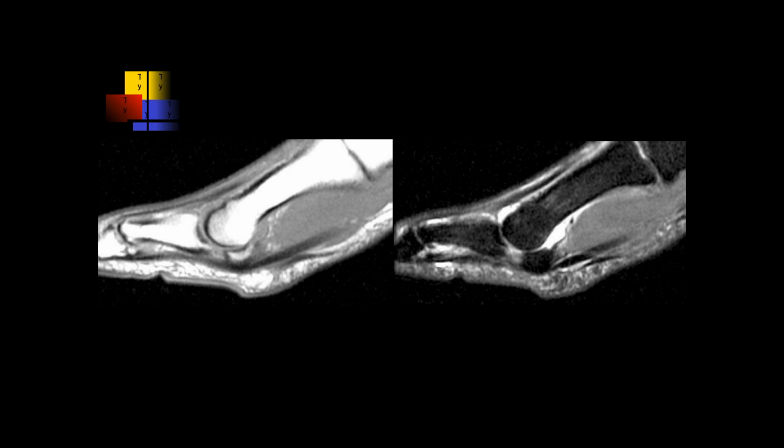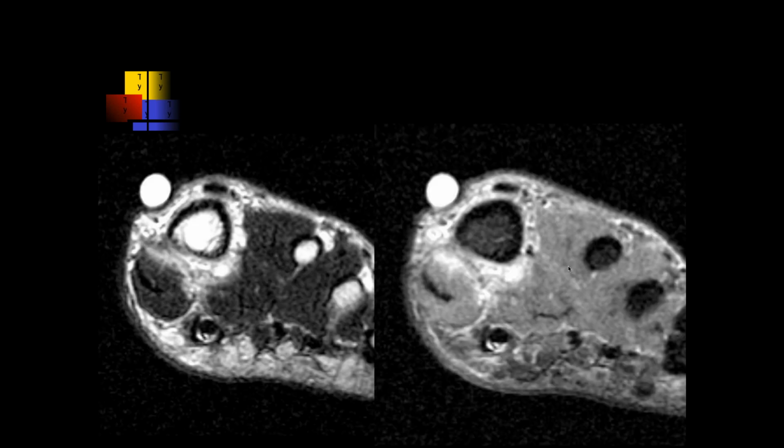So we'll continue on tendons. Jennifer, what do you think of this case? All right. Well, here it looks like we're looking at the first MTP joint, and kind of distal to that sesamoid, there's some increased signal, I guess, in the plantar plate or the flexor tendon. So I'm concerned about an injury, and there is an effusion. Yeah, so there's a little bit of fluid here. Fluid there in the tendon sheath.